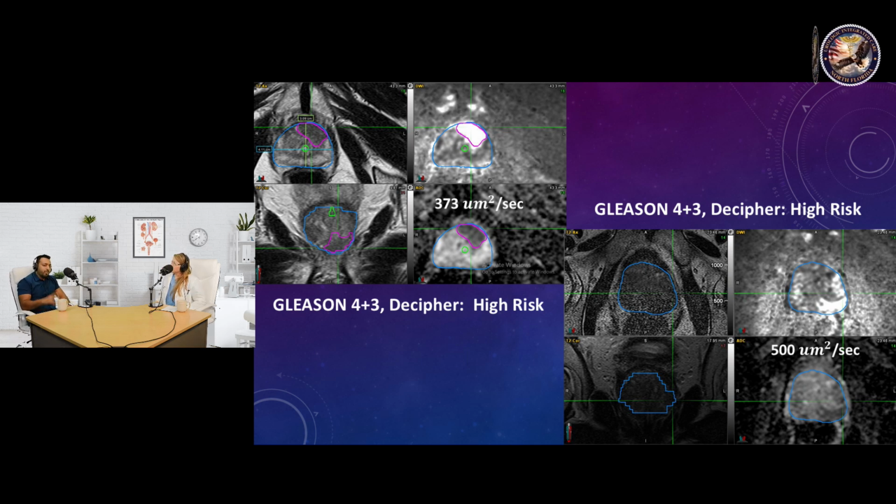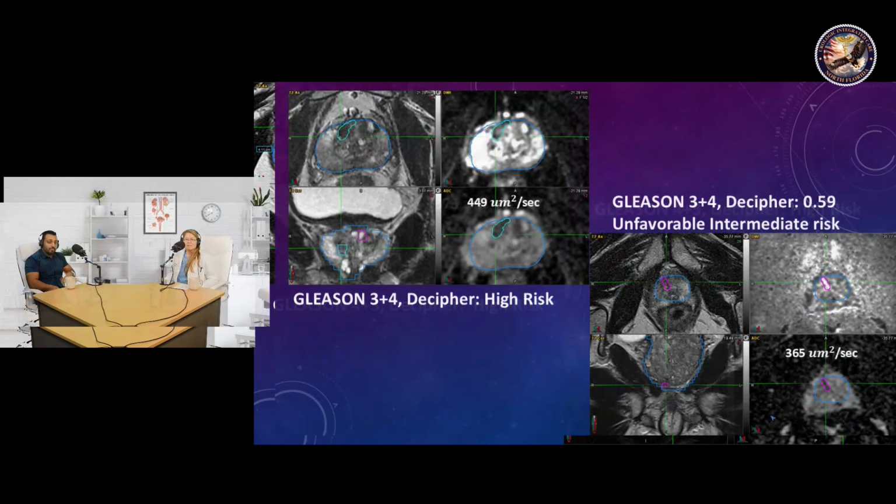Yeah, and that happens. But what I find really interesting is that even with the polluted T2 weighted image, you'd expect those kinds of pollutions to affect all the sequences: the diffusion, the DCE, T1, T2. And even then, the diffusion image is pretty powerful, and I assume it helped you determine the next step for this patient. Exactly. It allowed us to at least identify an area that looks suspicious. Okay, next slide.